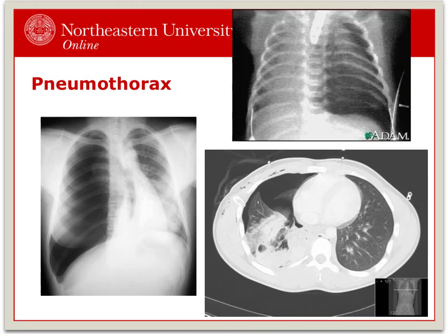A pneumothorax is the absence of lung tissue seen on an image as a lucency or hypodensity. We can see this one clearly at the costophrenic angle. Patient presents acutely short of breath, with pain in the area and poor gas exchange, which will result in low oxygenation or O2 saturation.